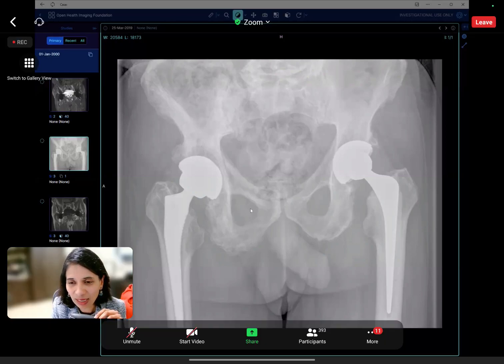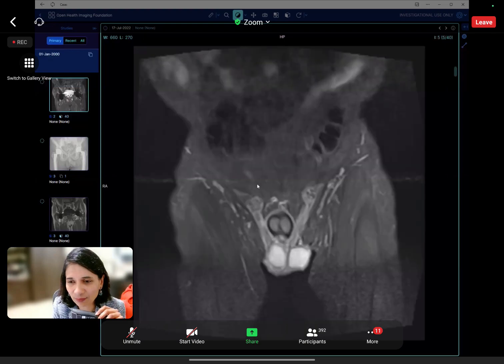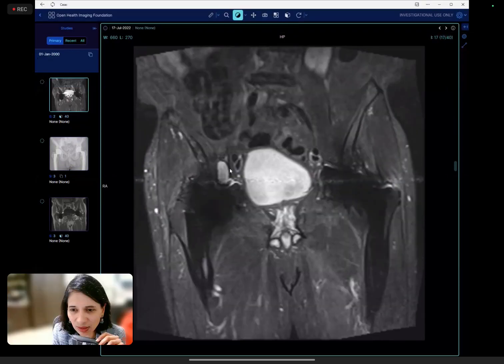with pain. But you also need to remember that the patient has a prosthesis. Could it be prosthesis related? I think you came back to that when we looked at the MR and you asked whether there was history of any trauma, because periprosthetic fracture can give you that pain. So that was good. But if you look at the MR itself, you can see that there's this pocket of fluid. Can you see this? Yes. It has a black rim around it.